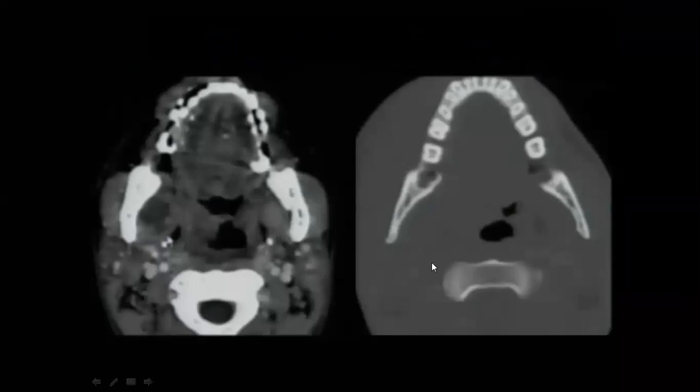Okay. This patient has this appearance. I think you can see with me that there is something going on here, apparently cystic or necrosis. This is post contrast, so you can mention that it is a non-enhancing area here. So where is this appearance? This is the parotid gland, right?